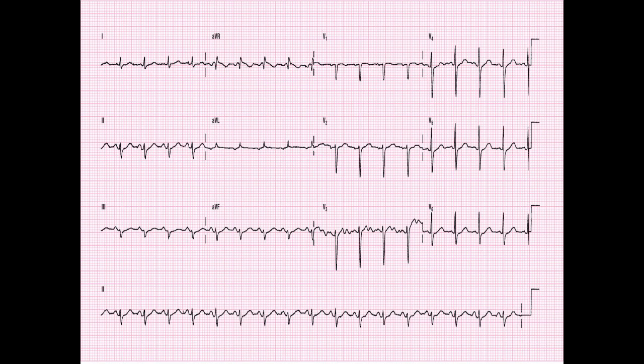So let's look at this EKG. Everything's looking good. Normal sinus rhythm. It's not too wide, or at least QRS-wise not too wide. We like that. Let's look at axis. Lead 1 is up, mostly up. aVF is down, mostly negative. We have left axis deviation. What about lead 2? Is that up or down? It's mostly down. We have pathologic left axis deviation. Pathologic left axis deviation automatically equals, drum roll.